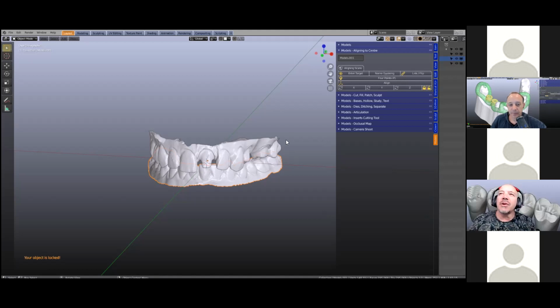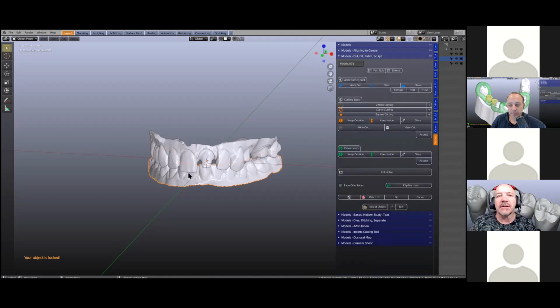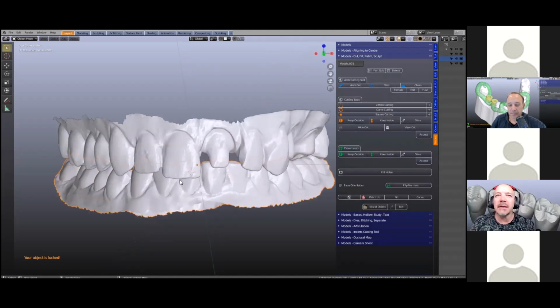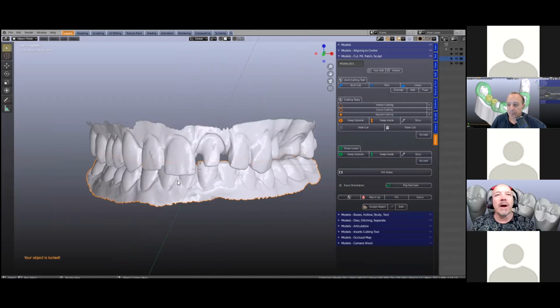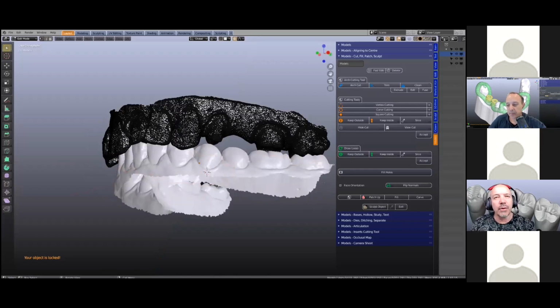So what we're going to do now is cut these meshes. We don't always have to cut the meshes, but from what I've seen, the mess that's coming through on scanners sometimes has bits and pieces all over the place. So how do you edit these meshes? Sometimes, like you said, you might have holes in it or rips and things like that, Michael.